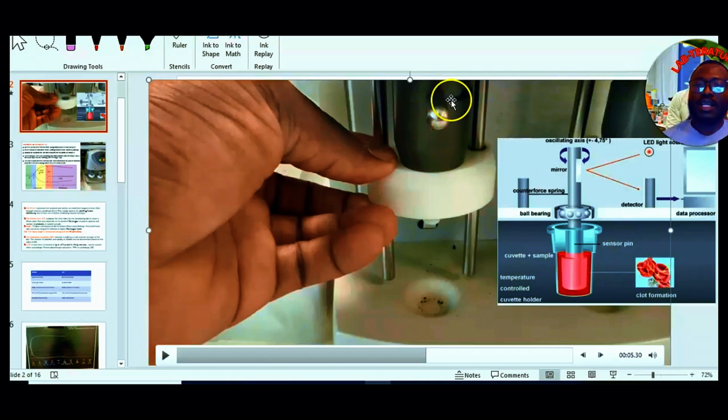This is another lever that turns right to a testing position, and this position now is a load position, and to the left side is called eject. That is when you don't want it to continue the reaction. For instance, if it gets to 30 minutes and you don't want it to go to 60 minutes, you can just get rid of the process and interpret it by probably multiplying the LY30 by 2 to get 60 minutes. So we won't go into that yet, but just to give you an explanation of that, that's what we mean.